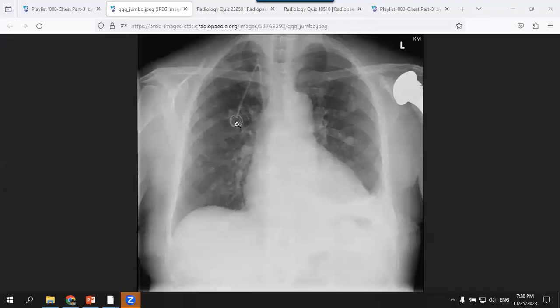So in young age, think of a congenital disorder. In an older age group, most likely it is related to chemotherapy. Look at the bones, look for any evidence of metastasis, look for the breast shadow. So this tunneled central venous line will be the clue in your case, most likely. Add other findings to reach the diagnosis. Candidate 2 had a good approach in this case, and the first diagnosis for multiple lung nodules is metastasis.